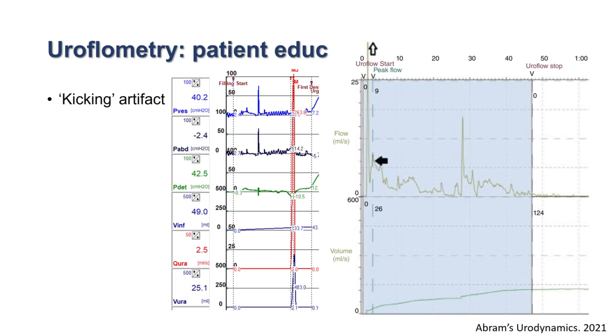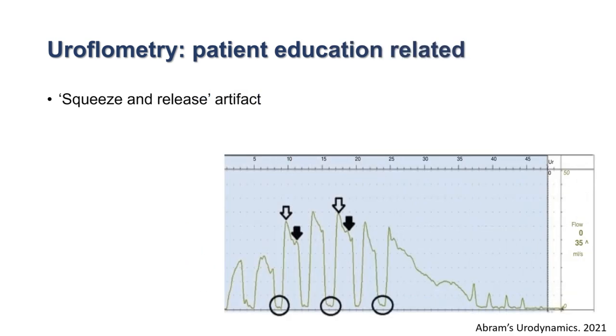There can be kicking artifacts. All of us have seen that while recording the uroflow, the patient touches the transducer, and then there is a large sharp peak. Most of the softwares will have a provision of cutting it off during interpretation.